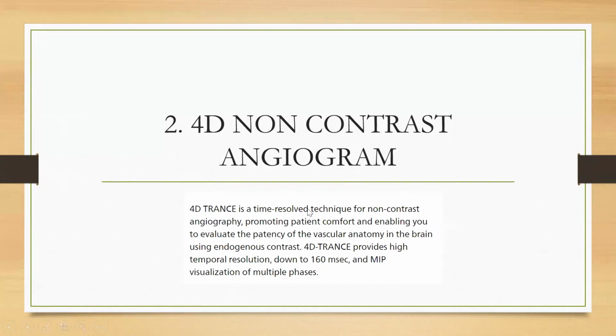And coming to the next thing, it's a new imaging technique, a non-contrast 4D angiogram, 4D TRANCE. This is also a new technique. Without contrast, we are able to image dynamically, with a temporal resolution of up to 160 milliseconds.